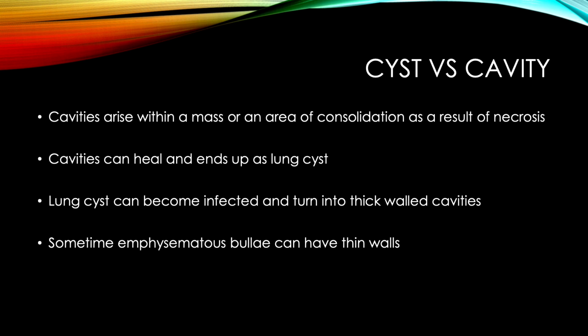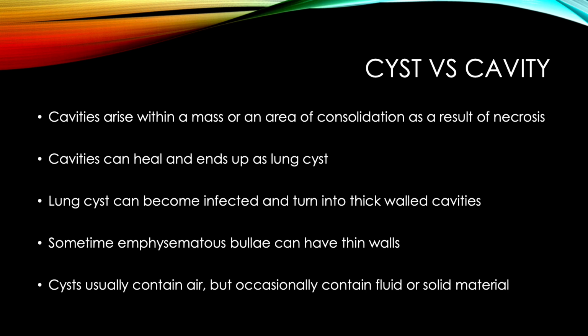Cysts occur without associated pulmonary emphysema. Cysts usually contain air, but occasionally contain fluid or solid material. The term is mostly used to describe enlarged thin-walled air spaces in patients with lymphangioleiomyomatosis or Langerhans cell histiocytosis. Thicker-walled honeycomb cysts are seen in patients with end-stage fibrosis.